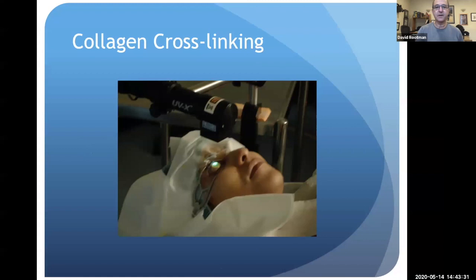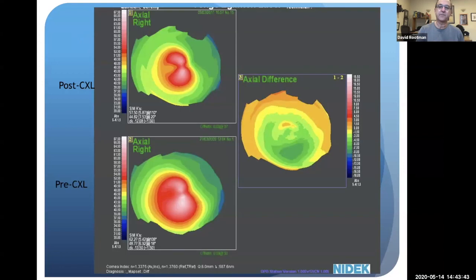So she's quite pleased with it. Now, what about after corneal surgery? We can utilize topography for making the diagnosis of keratoconus and deciding on if a patient is a good candidate for cross-linking. We can also utilize it to look at the post-operative effects of cross-linking. This is one of our patients who underwent cross-linking. You can see this is from 2009. This is what the patient looked like pre-op. Has sort of this kidney bean shape, very, very steep cornea with 13.5 diopters of astigmatism.